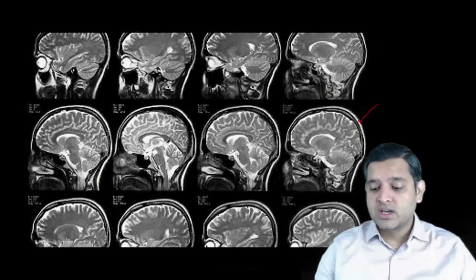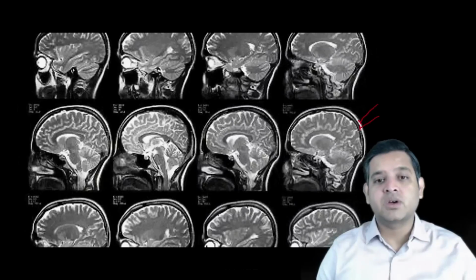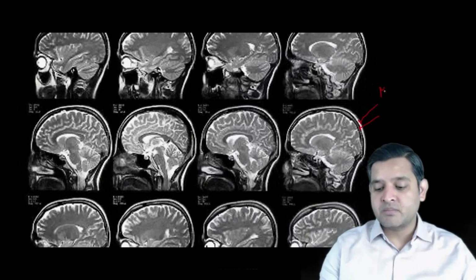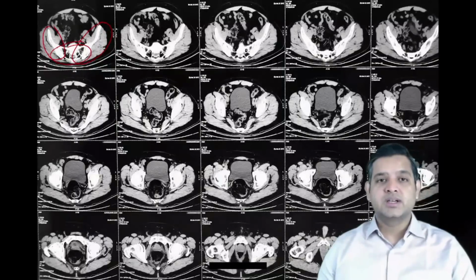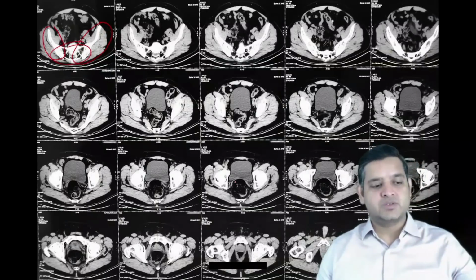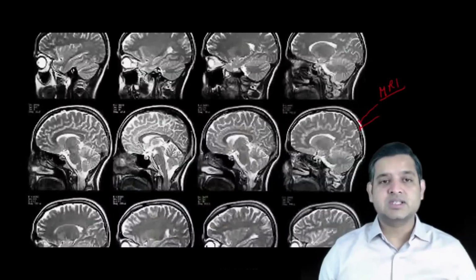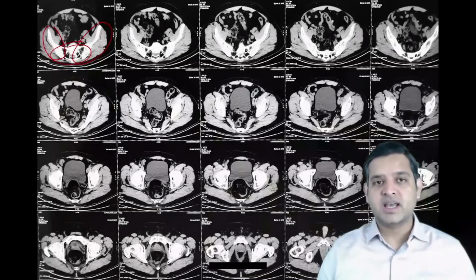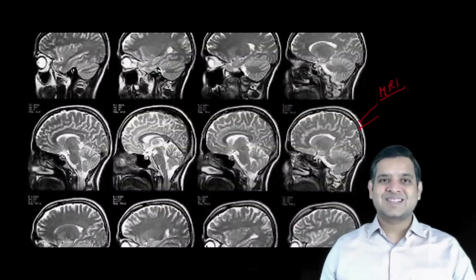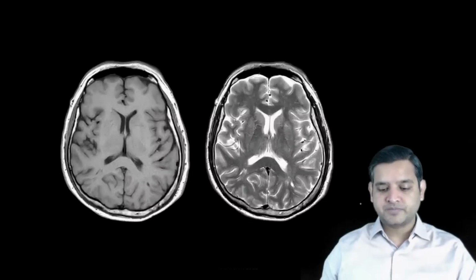So this is cortical bone, and if the cortical bone is black, this image is MRI. Let's go back once again. This is a prototype image for a CT scan, whereas this is a prototype image of an MRI. So CT scan and MRI, this is a transverse section and this is a sagittal section. I hope all of you can easily appreciate it.